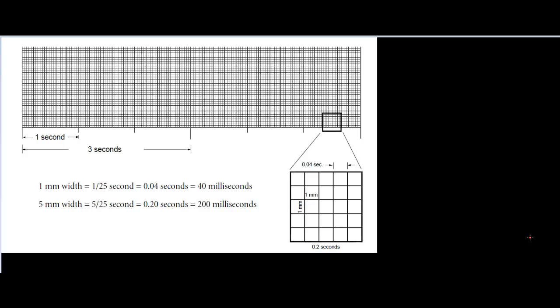As you can see, it's essentially graph paper. It has some height to it, but not a lot, and it goes on forever. The length of it is as long as the roll of paper is. The height is not nearly as important to us as the left to right part. The height really has to do with how much tissue is involved.